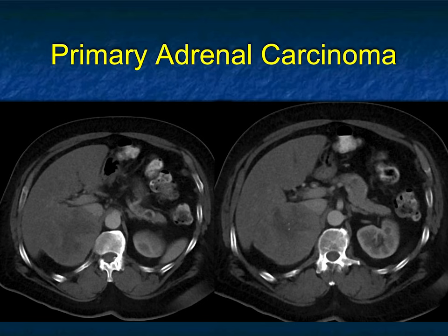Large mass, solid, somewhat necrotic. Again, with ACC, some are very vascular, and some, like in this case, are relatively avascular.